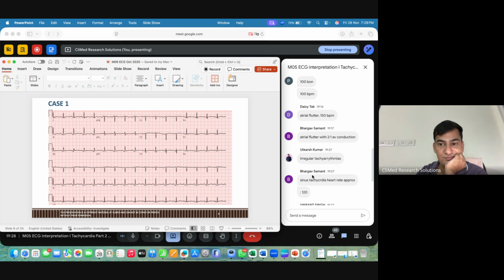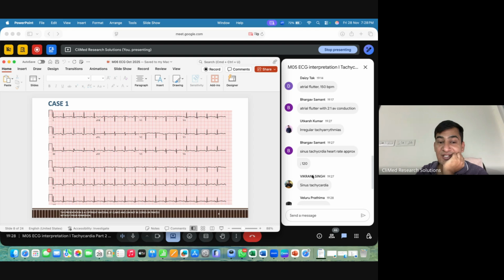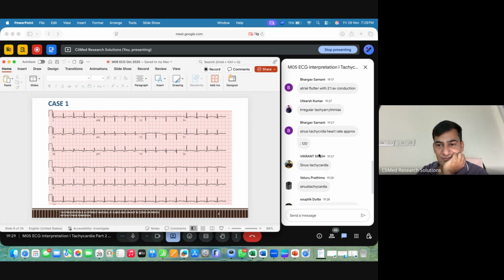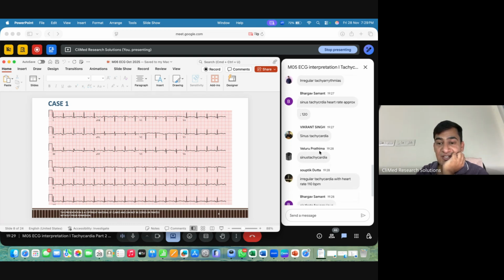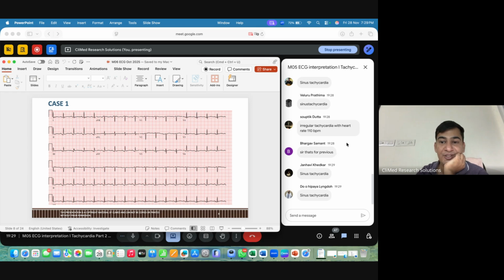Oh my God. You have studied too much, literally. In that case, irregular tachycardia. Who is saying irregular tachycardia? How can you say irregular tachycardia, Utkarsh? Justify. Sinus tachycardia, irregular tachycardia with the heart rate of 110. Okay, a heart rate of 110 can be considered, but how irregular? Tell me, where is it irregular tachycardia? Remember this. It will be useful for you in the future slides today only.